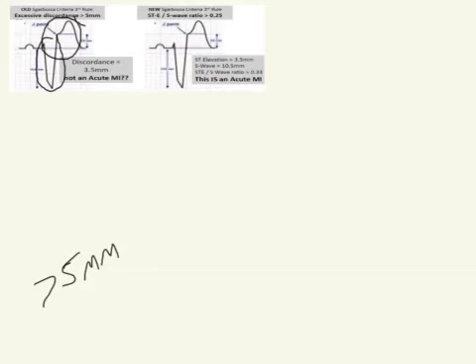So the modified Sgarbossa criteria is going to help us identify more MIs. The normal Sgarbossa criteria has a specificity of approximately 98%, and it's 20% sensitive. With adding this modification that I'm about to show you, we increase that sensitivity to almost 95%.